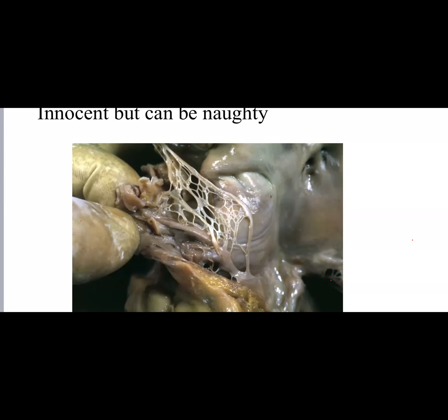But in echo, we don't see it as good as this one, but we see some filamentous structure swimming into the cavity of the right atrium. Okay, so that is how it looks like. This is an embryonic structure. It is benign, no problem with that, but we usually have to report it. And sometimes it can be naughty for the electrophysiologist, by the way. It happens once or twice.